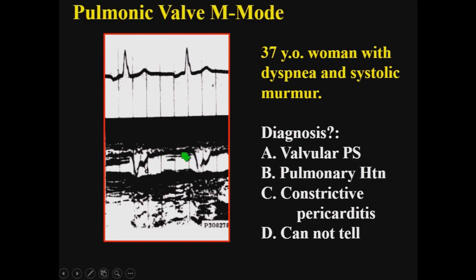This you see only when the pressure is elevated. And then when the valve is open, you have this unusual characteristic motion that is called flying W. So when you have a combination of no atrial kick and a flying W, this is a marker of severe pulmonary hypertension, usually a mean pressure of 50 or more.